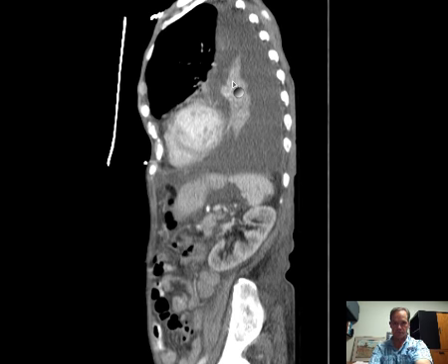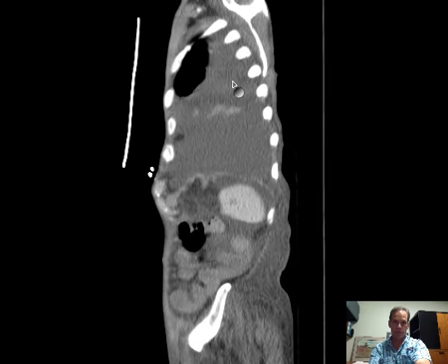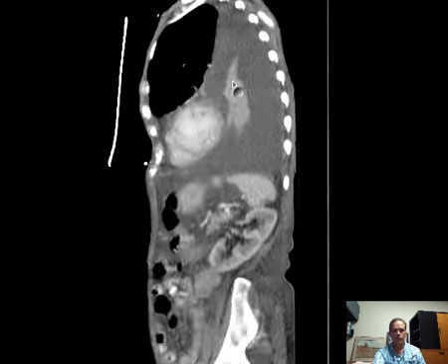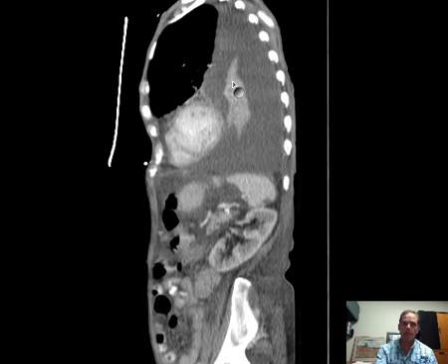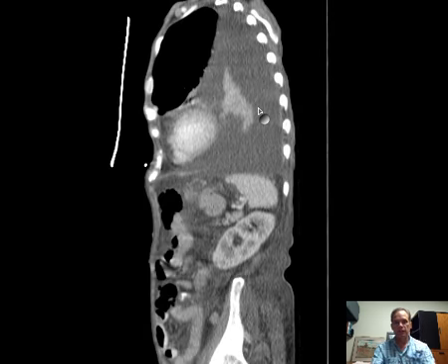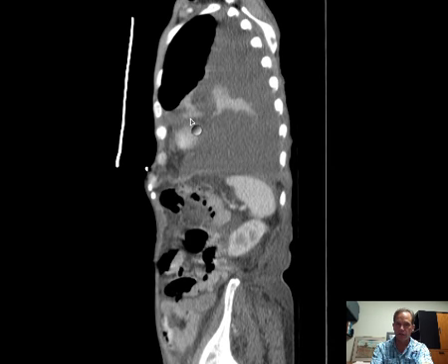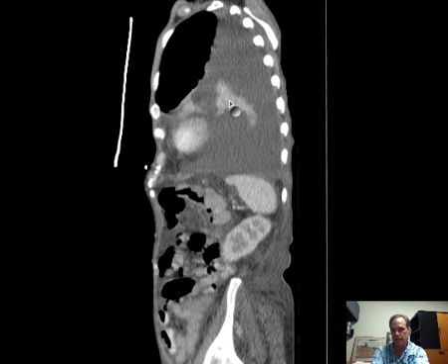Okay, what do you think this is? Left upper lobe, left lower lobe. Okay, so you see it in the sagittal. Well, here, remember again that, like on the right side, the major fissure on the left courses obliquely. That's a little bit of a different angle, but it's very similar. And so it's safe to assume that this is the left upper lobe, and this is the left lower lobe. Now, there is no middle lobe on the left. There is something like it, which is the lingula, a component of the left upper lobe. And here's that lingula.